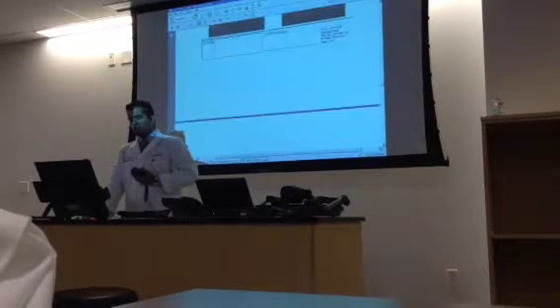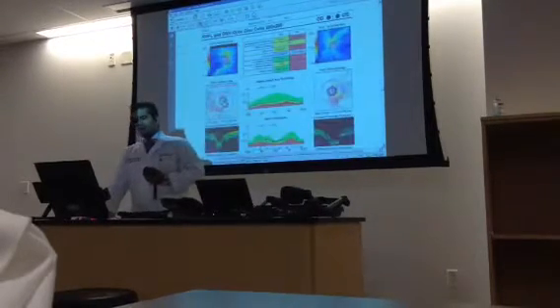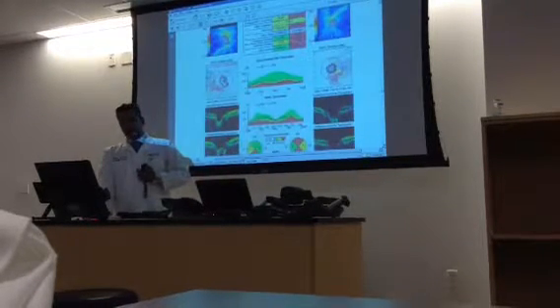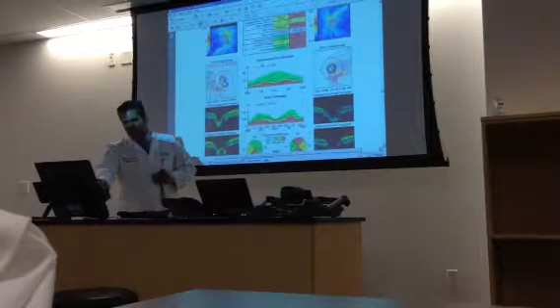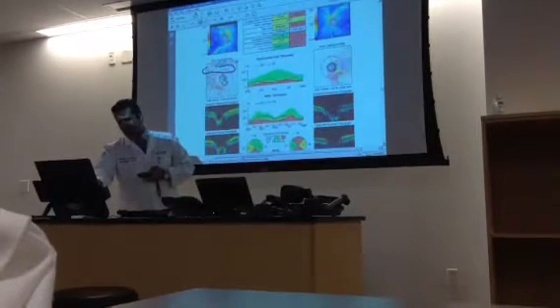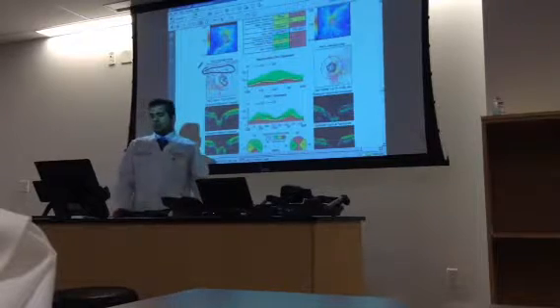You go to page number 10, you see the same device has a different output, which is more recent output. So even though the signal strength is great, look at 8 of 10, you look at this picture, fundus image, and you see these breaks in blood vessel. Can you see that? Can you see a little break in blood vessel there? See how this blood vessel is chopped off? Okay, that's because of eye movement.